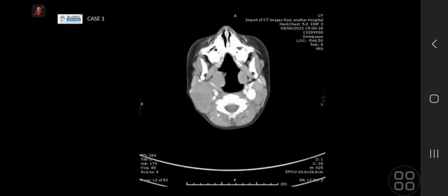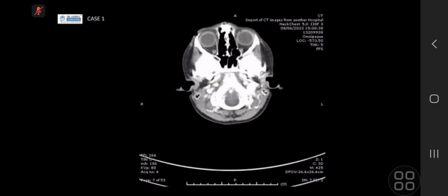Okay, I think I will go to MRI with contrast. Okay. All right. So, the ones that you mentioned are often a bit more vascular, which is why we didn't think it was a glomus tumor or one of those paragangliomas. Rather the glomus tumors really, because they tend to be a bit more vascular. So this one seemed quite homogeneous in the region of the head and neck.